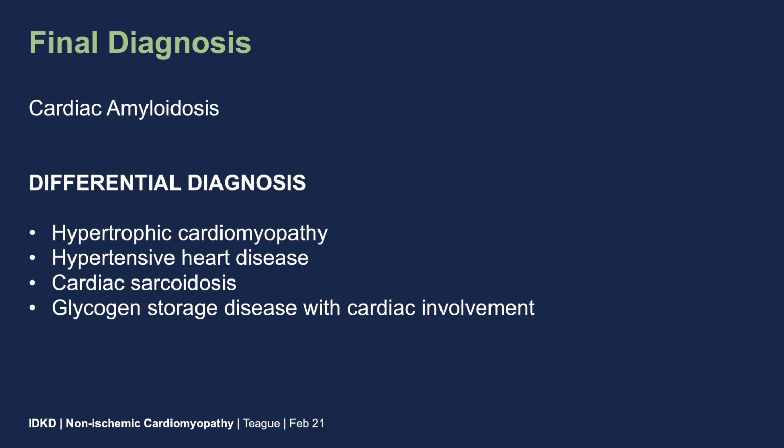The appearance of the TI scout images and difficulty picking the best TI time are probably the most useful in making the diagnosis. If you see diffuse subendocardial delayed enhancement, it is pathognomonic for amyloid, but this pattern is not very common. A more diffuse, patchy pattern of delayed enhancement is much more common. The differential includes hypertrophic cardiomyopathy.